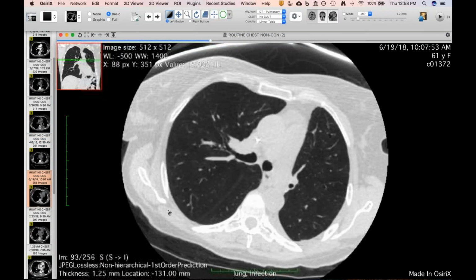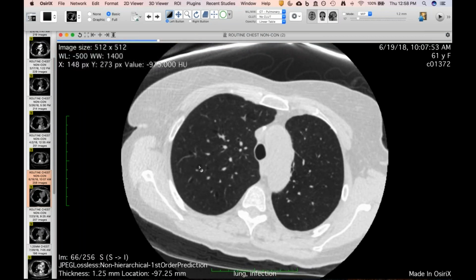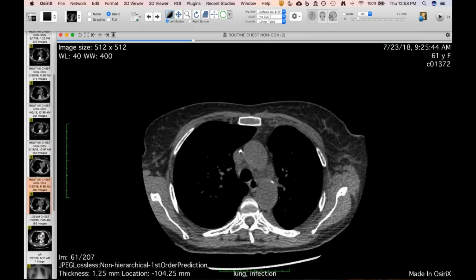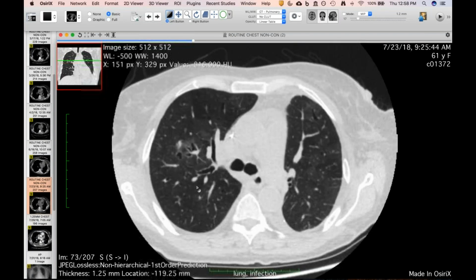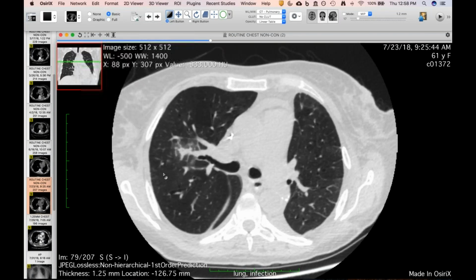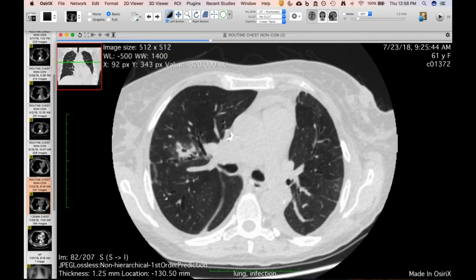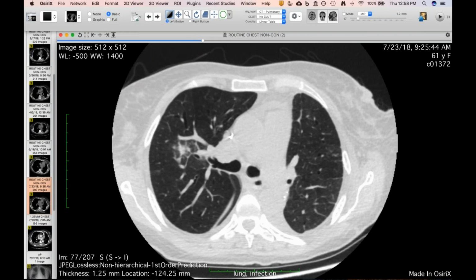She relapses again, comes back in. So in the interim, her lungs look reasonable other than the underlying abnormal airways. This is now June. Then comes in July, neutropenic fever again. And Howard, I know you in particular, you'll like this next case. This is what she looks like on July 23rd. Just has a little nondescript area of consolidation centrally in the right upper lobe. Not really much you can say about that other than it certainly would be a focus of infection. And really, I don't know what organism.